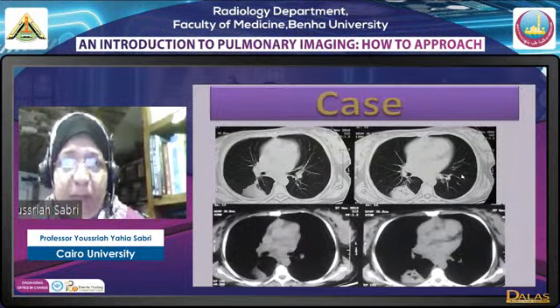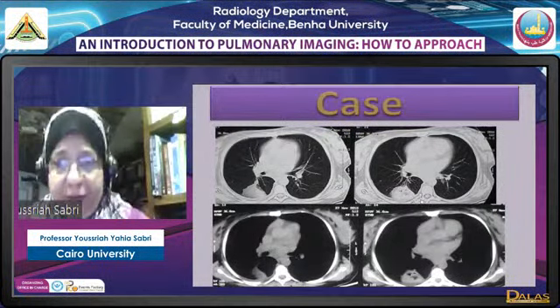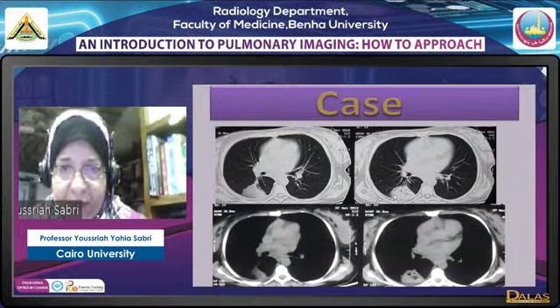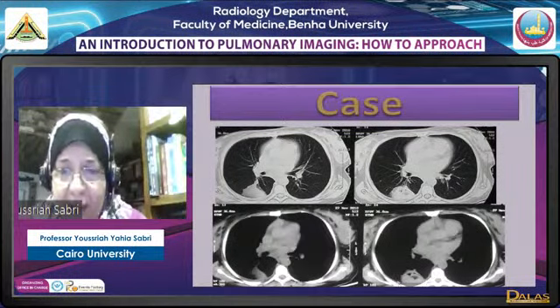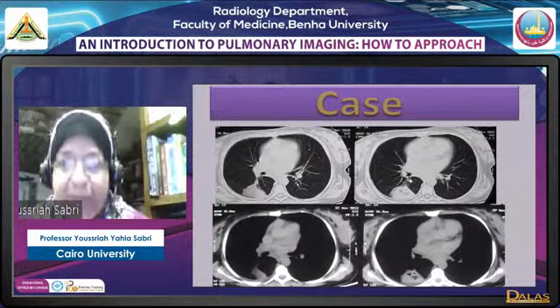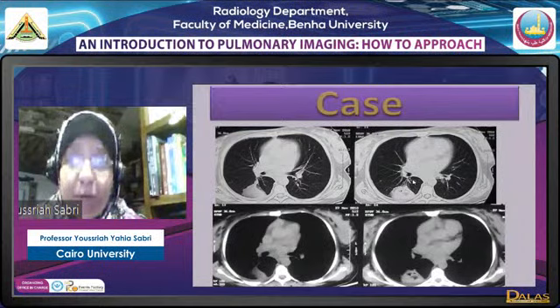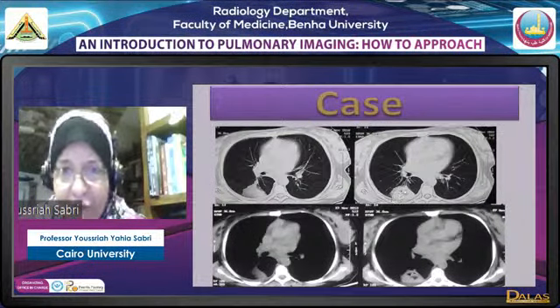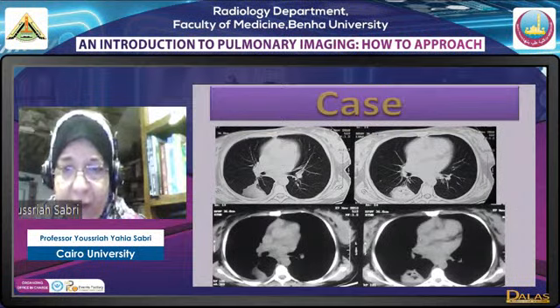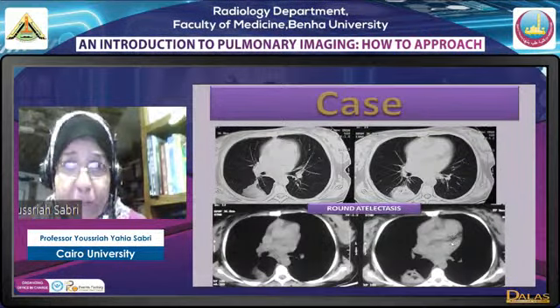Okay, here we have another peripheral lesion, and this peripheral lesion has many characteristics that should be known by heart. Number one, this peripheral lesion, which may be a mass or a nodule, here we have a mass. Subjacent to it, there is pleural thickening, and medial to it, joining it to the hilum, there are crowded markings. So I have three things, a triad: crowded markings, which mean volume loss, and a mass lesion, which is peripheral, subpleural, with overlying pleural thickening. This triad equals round atelectasis.